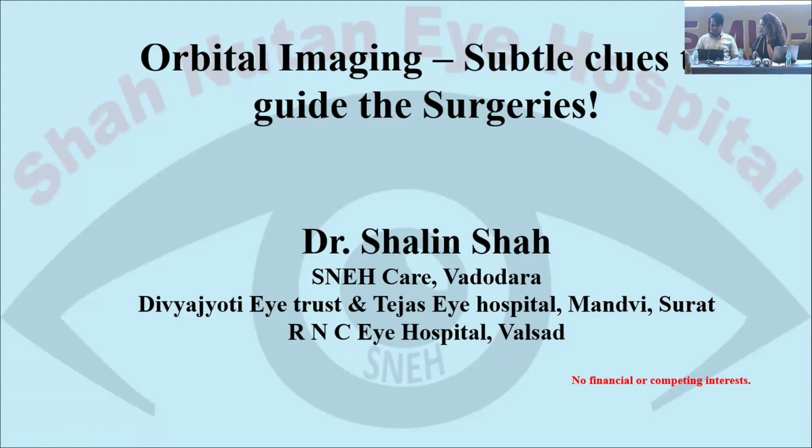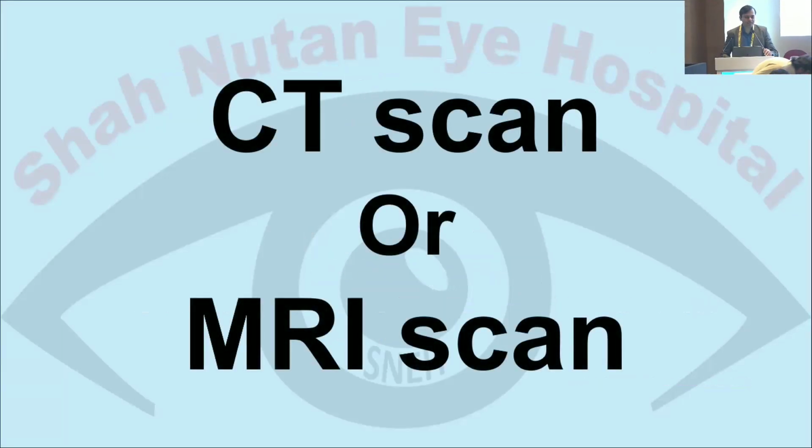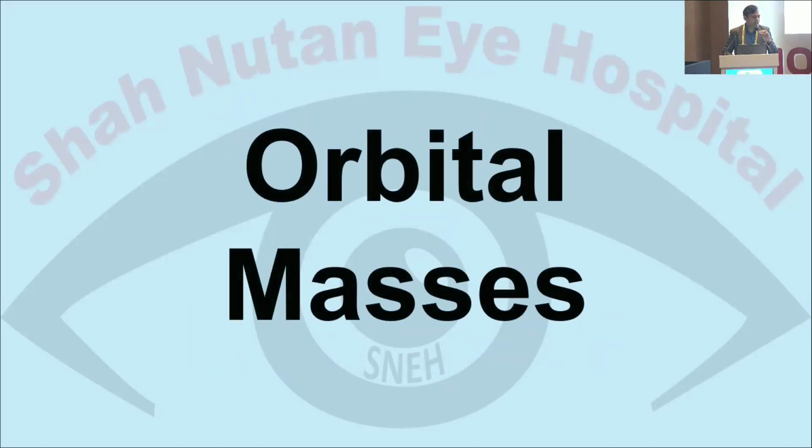Over to you. So, good evening. I'll take you on a brief journey regarding the confusions I used to have about whether to go for a CT or an MRI. I think everyone has somehow faced this dilemma of which would be the best option before planning an intervention for the cases. So let's go case by case.